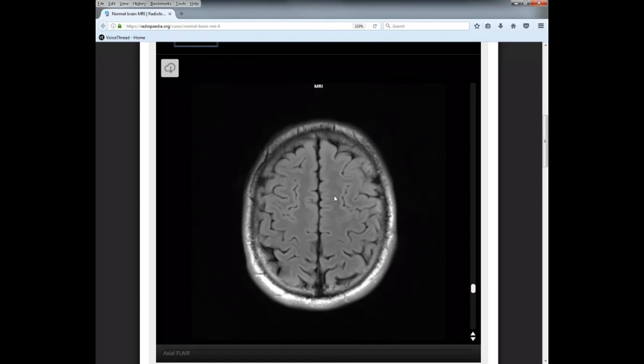Looking for the central sulcus, there are ways, don't YouTube it, but there are ways to see this in a coronal or a sagittal view. You don't need to know that for this course, it's very difficult to find it that way. I found this to be easy enough in the axial plane to be able to see the cingulate, you have to know for a test.